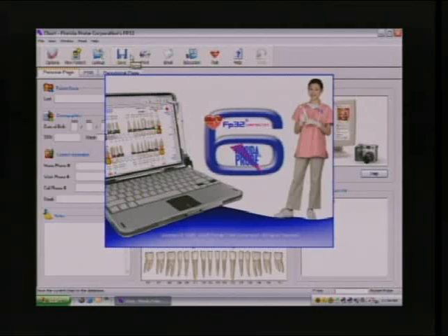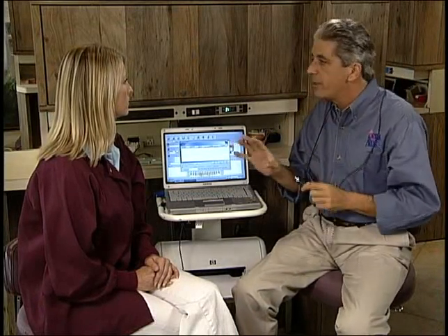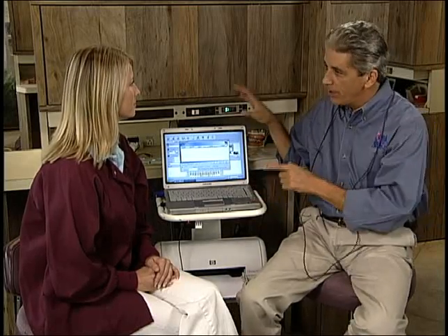Welcome to the Florida Probe. Now I want to hear that welcome. If I don't hear that welcome, then I want to stop and figure out why. Either my speakers are turned off or unplugged, they're muted, but the sound is a very, very important part of it for two reasons. Number one, it helps keep me on track during the exam so I don't end up with extra pockets or extra teeth. And also, the authoritative computer is delivering the message to the patient. You're not enunciating it. The authoritative computer is. And that's the interesting human dynamic. When the computer delivers it, the patient becomes more engaged.